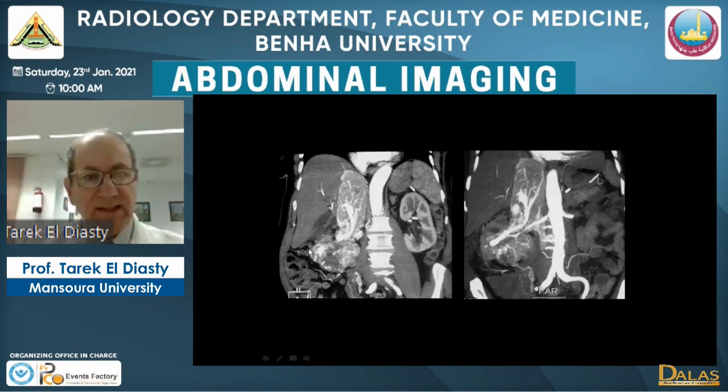Malignant right renal mass with vena caval tumor thrombus, with significant vascularity here in the thrombus. And you can see here some vessels in the wall of the inferior vena cava. So what is the stage? Many answers I received before for this case was T3B, because it invades the subdiaphragmatic portion of the IVC with no supradiaphragmatic invasion of the atrium. But this stage is T3C.